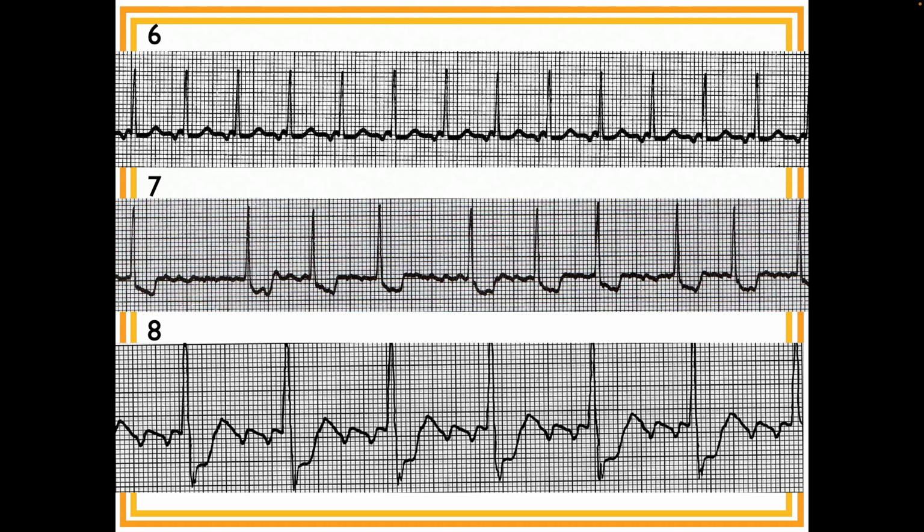What makes this probably a little more difficult is that there's ST depression, which pulls this one down, and then it looks as though this particular flutter wave is landing on the T wave every time. That's why this one is bigger, so you're seeing T waves. But it has the definite flutter wave pattern.